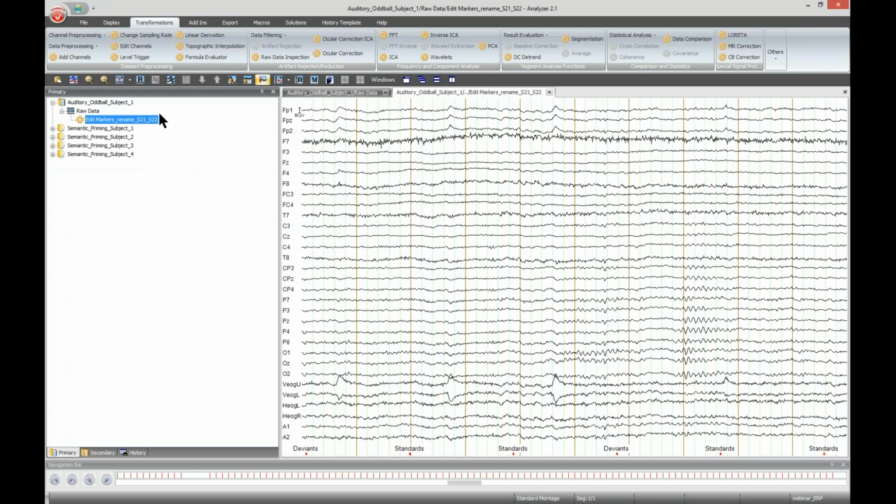I will do that throughout the analysis that I showed today. This is not only handy for the bookkeeping, but also quite important for analysis automation and analyzer. Of course, the operation infos that you can also find in this menu here, they give you the full information on what was done in each step, so you won't lose any details of the processing pipeline.